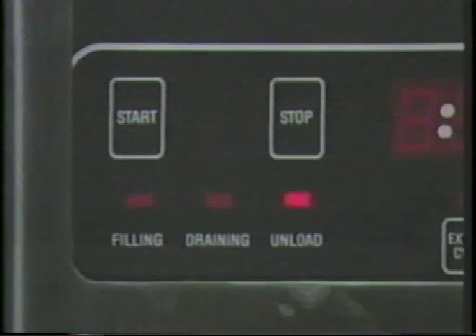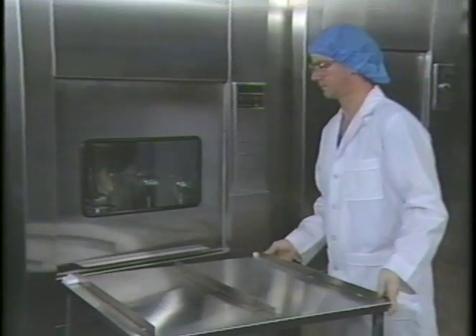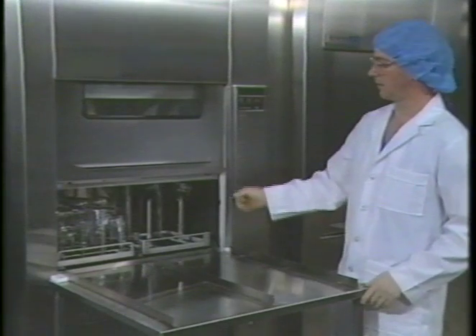for the proper time. The final rinse, which is optional on many mechanical washing systems, can be a pure water rinse. Pure water provides the opportunity to remove trace minerals left over from the tap water and helps to prevent the possibility of staining or spotting in the load. If the mechanical washer has a drying cycle, the load should be allowed to cool down properly before it's removed from the chamber. Care should be taken when opening the access door in case of steam vapor being emitted.